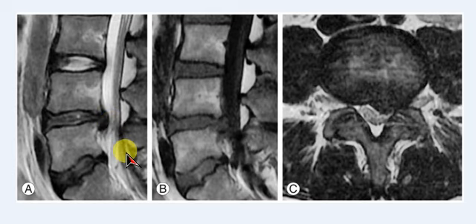So you need to remember this, and you need to see the level first, identify the level of the disc, and then there are some slices that are marked or numbered, and then you can jump to the cross section of that particular disc.